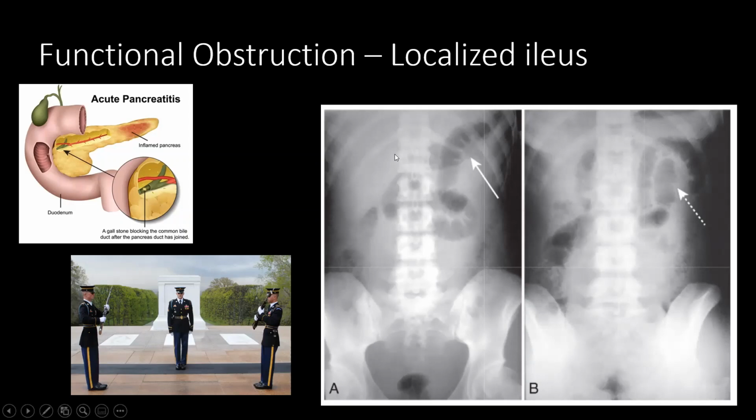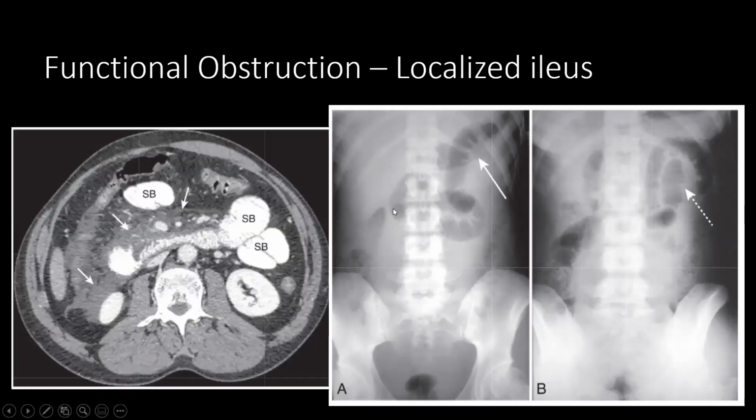So diverticulitis. How about the right upper quadrant? What do you think the inflammation is? Acute cholecystitis. Yes, exactly. So the most common inflammations regarding the quadrants: here cholecystitis, here pancreatitis, here appendicitis, and here diverticulitis. These are the most common to cause sentinel loops when I see them on X-ray.